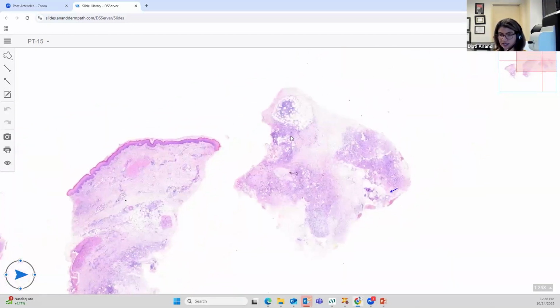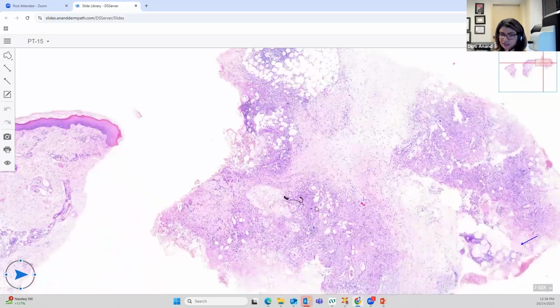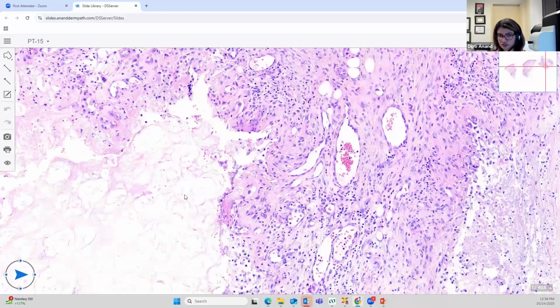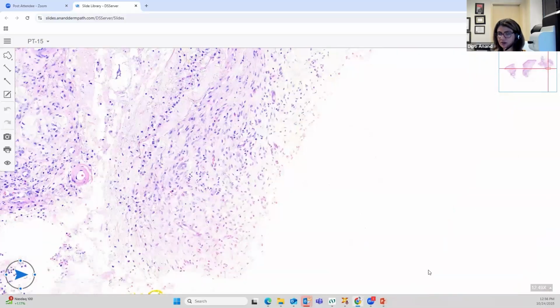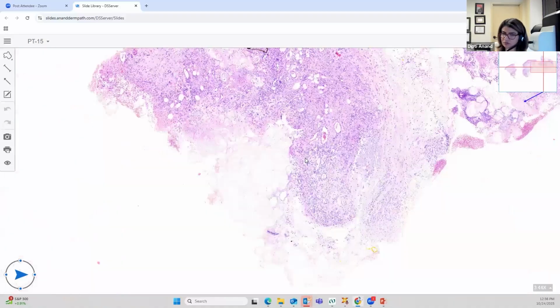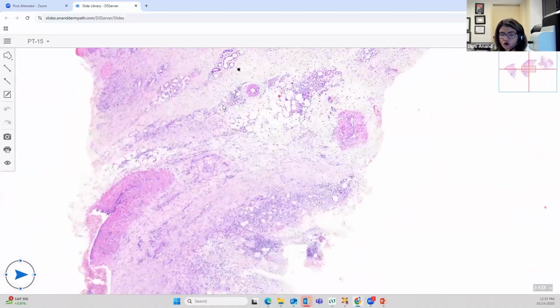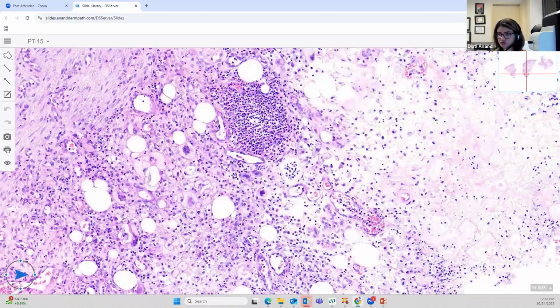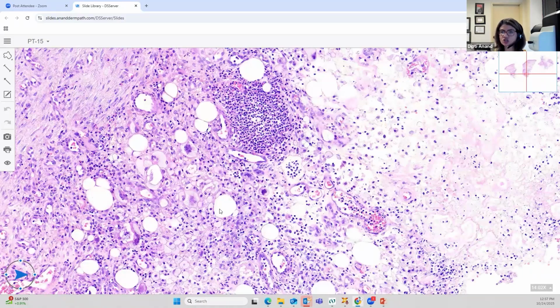You see lobular panniculitis, which is, again, when you look at the lobular panniculitis, it's a dirty panniculitis. You see neutrophils. So it makes you think about, is this infection? Is this erythema induratum? Is this calciphylaxis? So you will look for the calcium deposition. See how dirty it is. You see the neutrophils. It looks ischemic, right? So you will think about erythema induratum, calciphylaxis, but there is no vessel involvement.